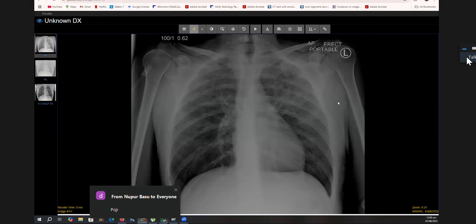Sir, could it be pulmonary edema? Do young men get pulmonary edema? No, sir, with a normal cardiac shadow and no... If I said he had a dry cough, dyspnea, and a fever, yes, sir, what does that make you think of?